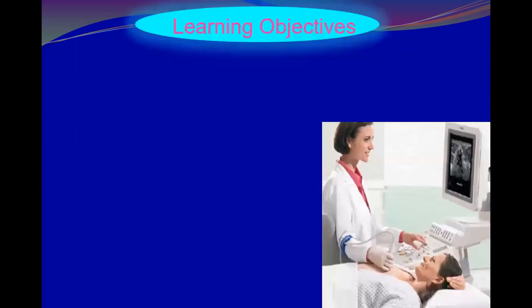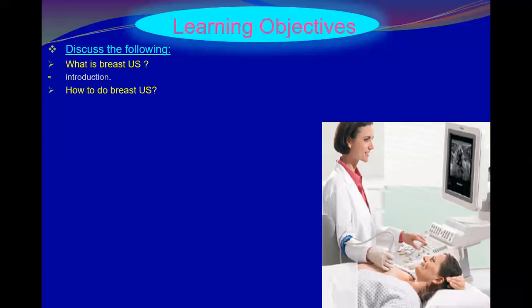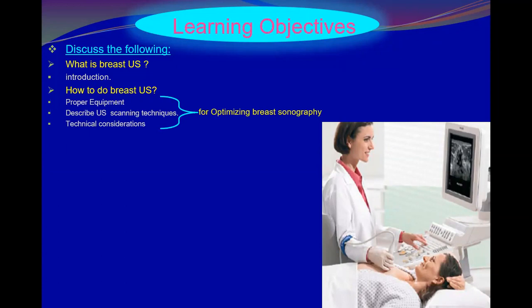Okay. The learning objectives of our breast ultrasound course is to discuss the following. We would like to understand by the end of the course what is breast ultrasound, how to do breast ultrasound, including proper equipment, describe ultrasound technique and technical considerations for optimizing breast sonography.